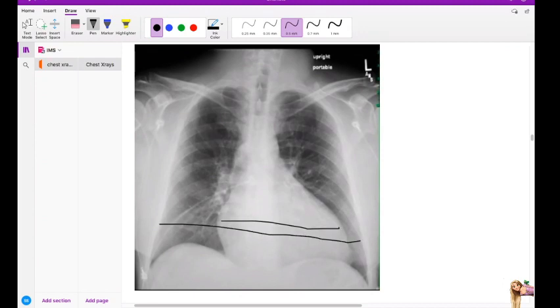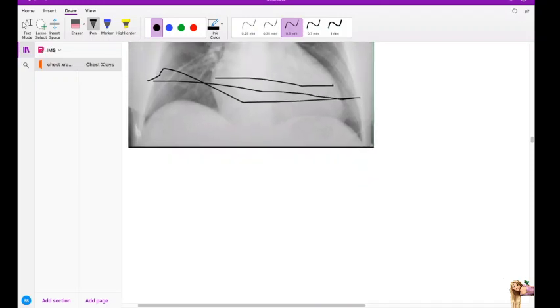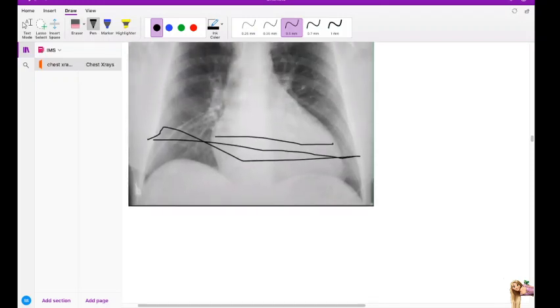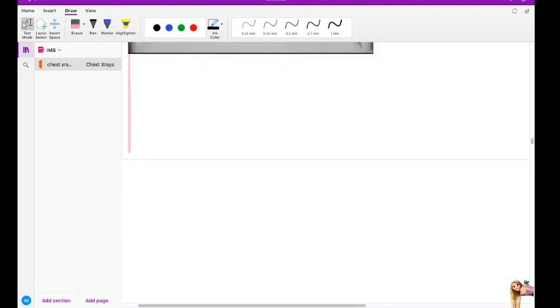Okay, cardiothoracic ratio. Yes, cardiothoracic ratio. So that is about cardiomegaly, like heart and mediastinum. We'll discuss more about heart stuff when I'm taking the heart things. I'm just nothing over here also.